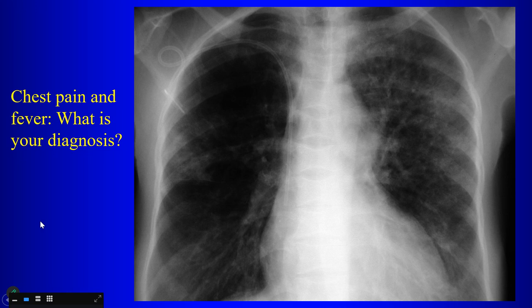So it looks like this patient has consolidation. Of course, you're going to be thinking about bacterial pneumonias, et cetera. But there's another finding. At first we see that there is a central line there, but there's another finding on the chest radiograph that really helps you. Can anybody see what the other finding is?